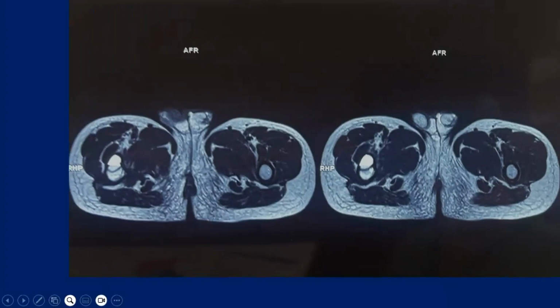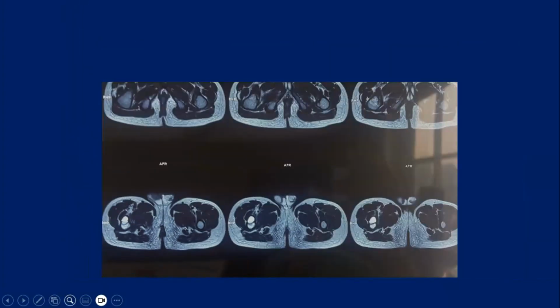Have you put any other image? No, sir. But Tashvin thought you all are so smart to find out from this image. Anyways, what I remember is even after these images, Mandeep and I were not very clear what this is exactly. Am I right, Mandeep? And then we had to move ahead.